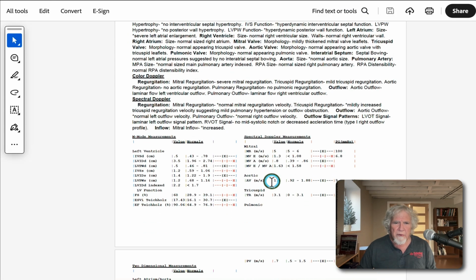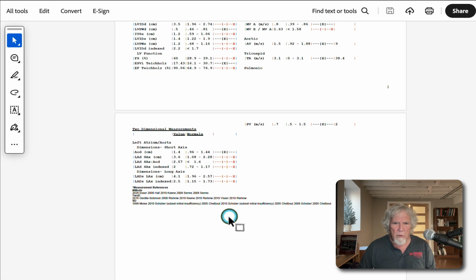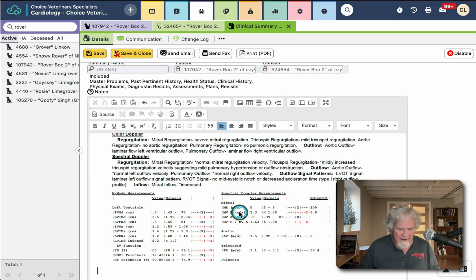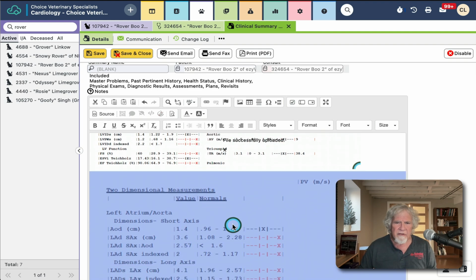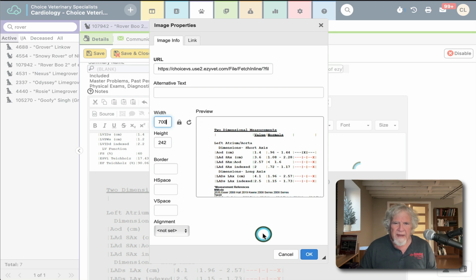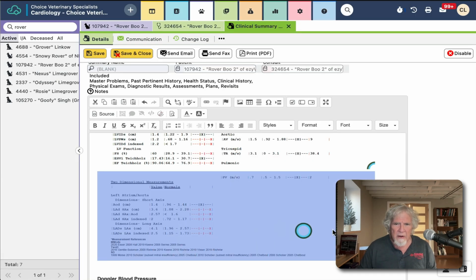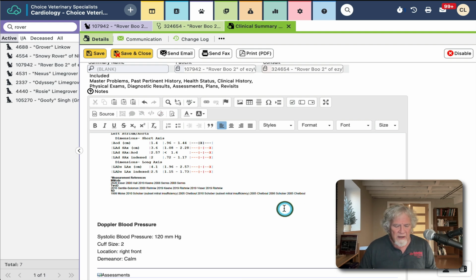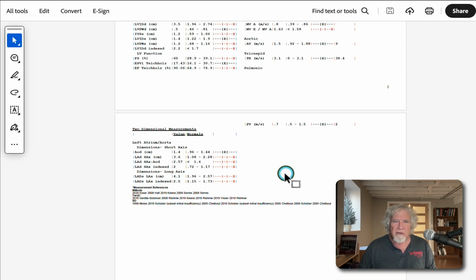And there was more to the report, including where I got all my references from. So I'm just taking another screen grab of the report. That's all, no partial screen grab. I don't like things at the end. I like to present value to the client as to what I've done. And again, I'm just formatting that quickly and saying okay. And now I've got everything formatted and in there, and I should provide the chart in there as well.